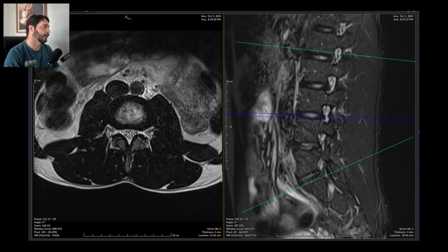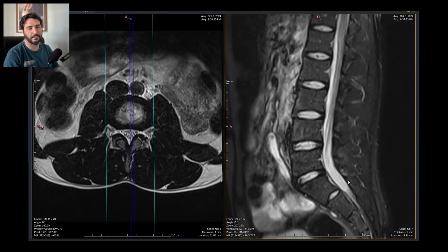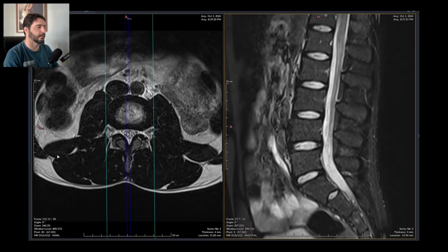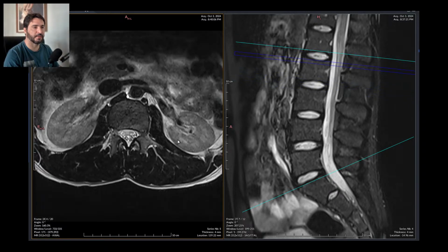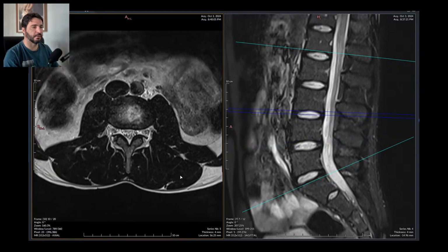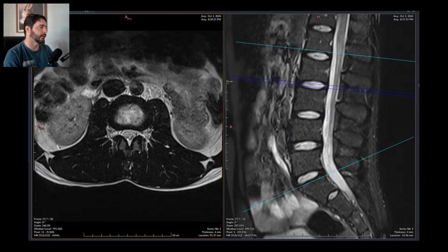And the slight edema of the interspinal ligament right there. This is quite painful. As for the perivertebral muscles, they seem fine, no hypertrophy here. This isn't really a fat patient. This patient is quite slim, so there isn't much overload, at least not in that sense, in this spine. So this is a very mild disease. Usually just medication and physical therapy is enough for a proper recovery.